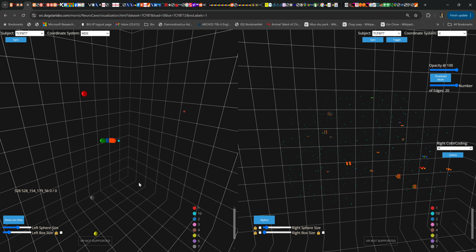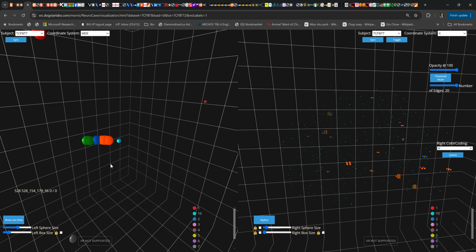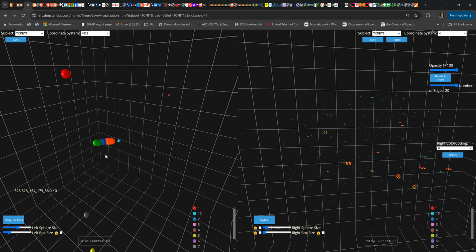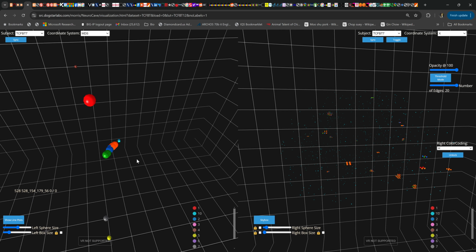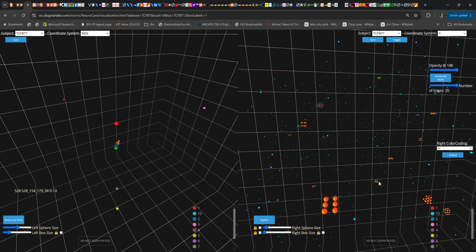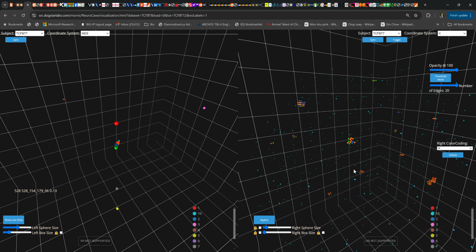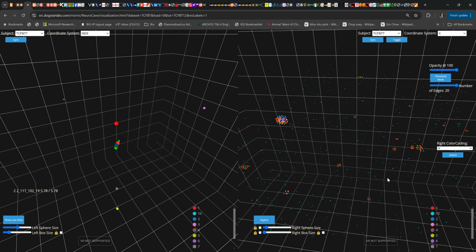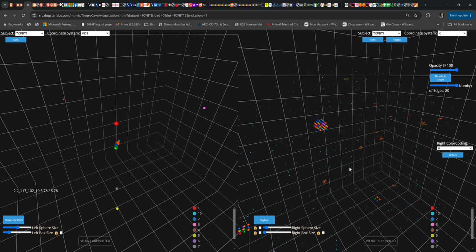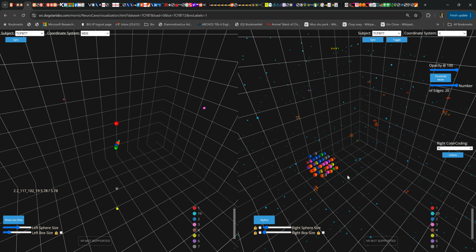The clusters are derived from the MDS coordinates. So regions that cluster together in the MDS transform are colored with the same color code as their positions. So this is a useful view here.